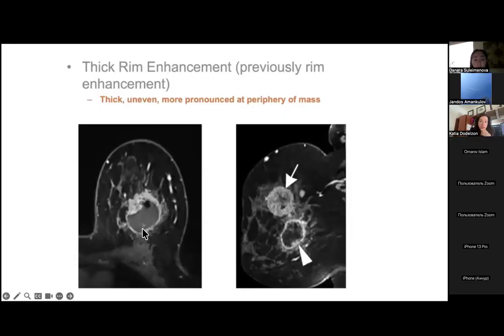One more thing to remember is fat necrosis. As fat necrosis calcifies, the granulation tissue evolves, and it can be irregular in how it forms. It has a lot of vascularity peripherally as the body tries to ward off the fat necrosis. So go back to your T1 not fat suppressed sequence. If this internally all is fat, it's much more suggestive of fat necrosis, and you may be able to follow it rather than biopsy it or call it a carcinoma, especially in a patient who had a history of surgery in that area.